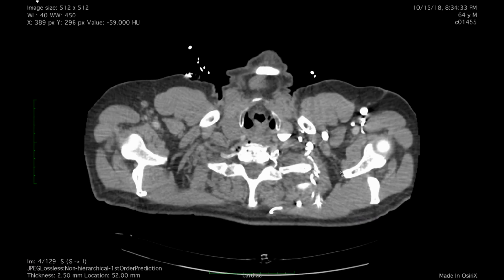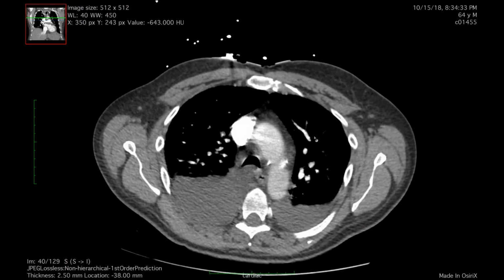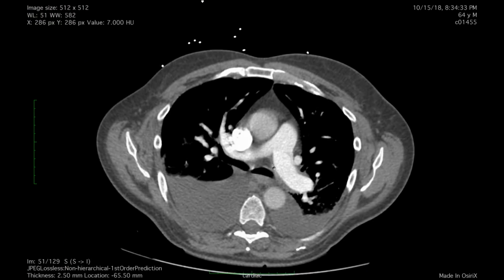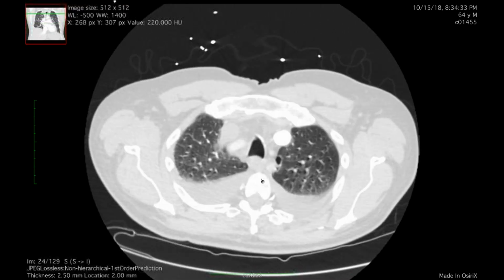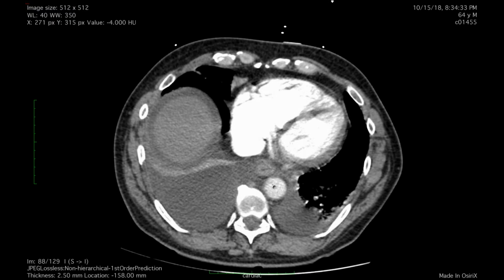Okay, this is a patient who came into the VA, and this was done at an outside VA, and I'll get to the history in a moment. You'll probably be able to guess what the history is. And this, of course, is a PE study. No PE. He's got effusions at this time, and maybe trace septal thickening. Not really a lot in terms of edema.